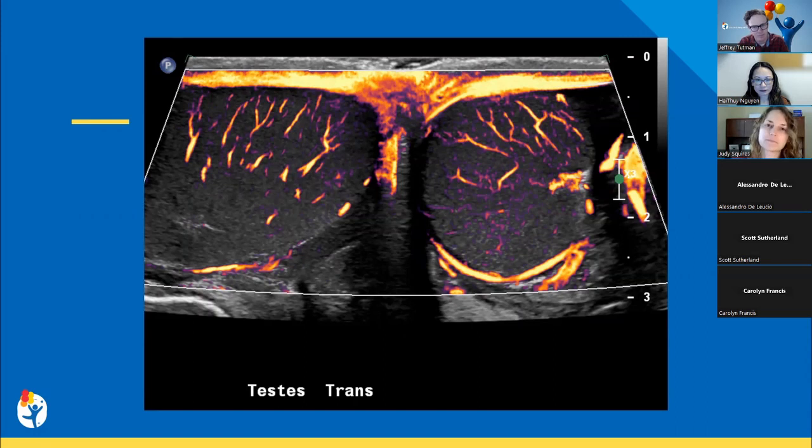It's definitely not part of our protocol yet, although the power and color Doppler imaging instruction is a little bit vague. It says something like optimize your settings to best demonstrate flow. Usually it's not needed. They'll just do some power Doppler images. I have found that when they can't get flow in cases of torsion, they'll demonstrate that there's legitimately no flow using, it's called B-flow with our machines, but it's very similar in appearance and technology. But I haven't changed what I've said based on a B-flow image or a microvascular imaging image just yet. Sure.